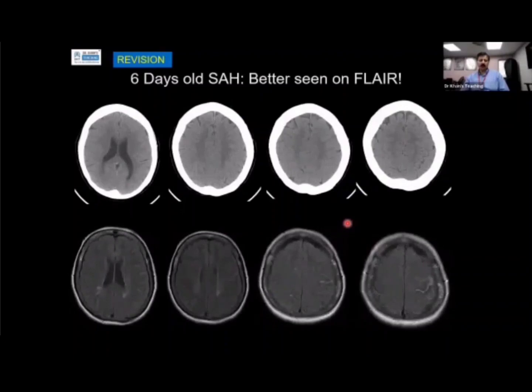Usually in the examination, they will show you this kind of finding on a FLAIR sequence, and you will tackle it like this: there is high signal within the sulcus here. This might be subarachnoid hemorrhage. However, it might be any leptomeningeal process, as in leptomeningeal carcinomatosis or infection, etc. So you have to give contrast.